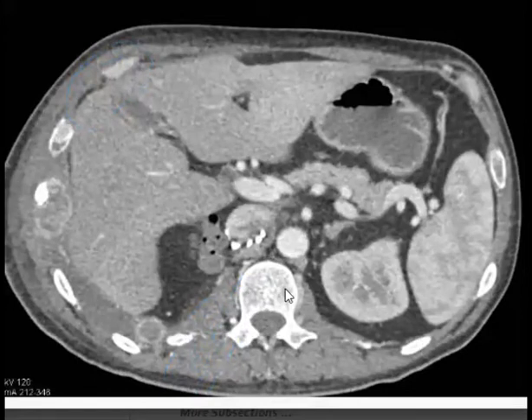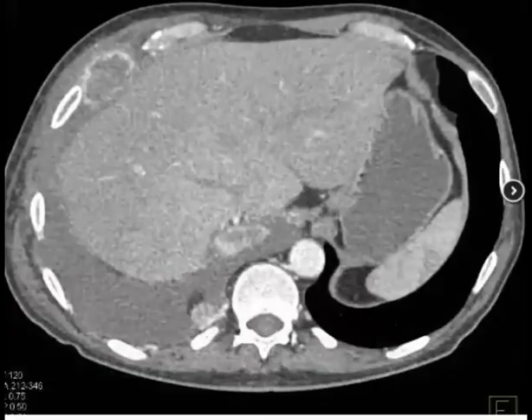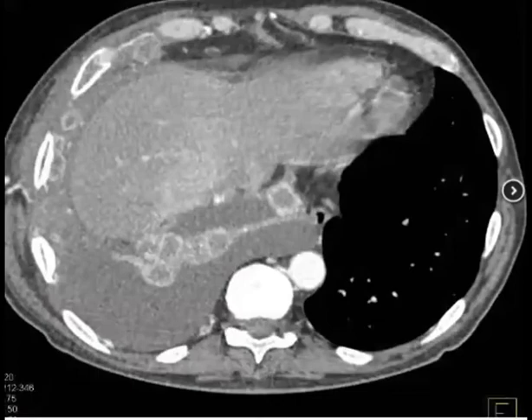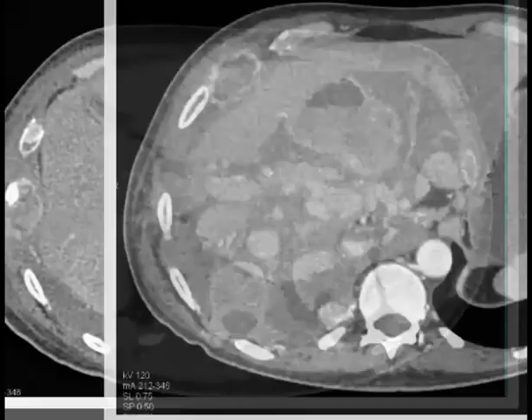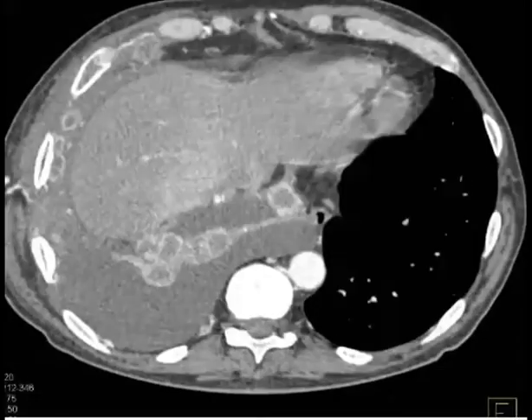And what else? Where is the clue? If you consider all this, until now they are metastases. It can be peritoneal carcinomatosis with pleural and peritoneal involvement. What else could it be?